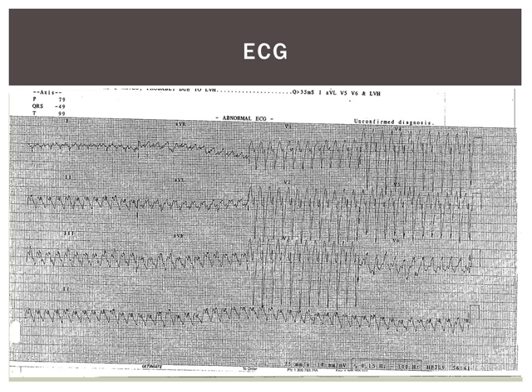This is her ECG. It's not a great projection, but it is the actual ECG from this girl, so it is important to see it. What you've got is a very fast, regular, broad complex rhythm with a left bundle branch block morphology with these great big deep S waves in V1 to V3.